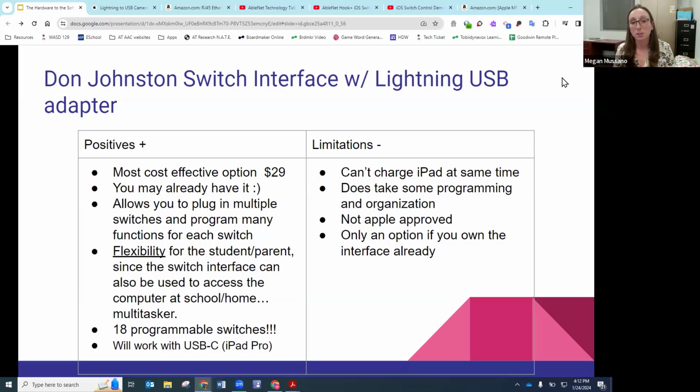if you do the space bar or the enter, the click, you can go to the next song. I explained that very poorly, but basically, if you have the keyboard function of the space bar, it will play and pause YouTube, and then you take your cursor and hover it over the next song button to click on YouTube. So anytime the student hits the switch, that's the click, it'll go to the next song. Anytime they hit the space bar switch, it'll play and pause. It just gives them another cause and effect activity to do at home, utilizing the same items they already have.